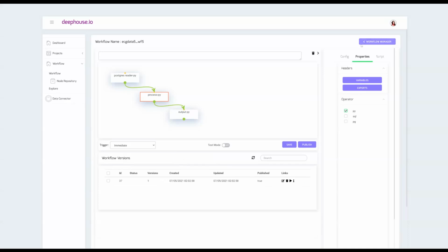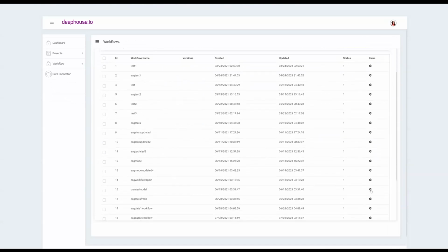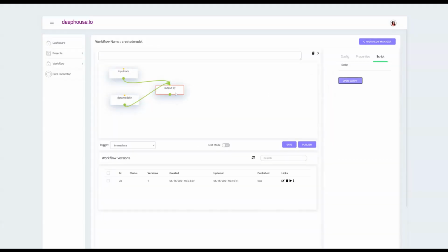So going back to one more quick sample of the machine learning example that we talked about, if you are interested in getting a new data set and determining if there is any alerts needed, for example, in terms of unusual activity in the heart rate, then there is a model that we have saved as a pickle, and that can be used for outputting any alerts for a specific patient.